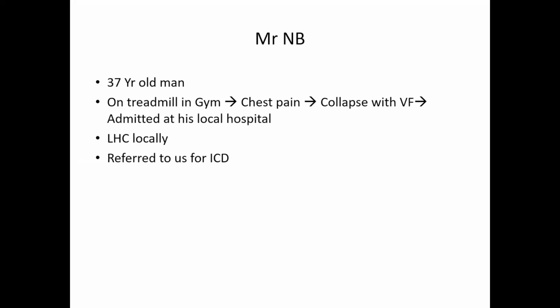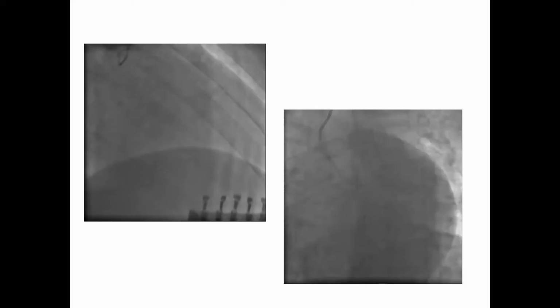Okay, so a 37-year-old man, he was on a treadmill, gets chest pain, he collapses with VF, admitted at his local hospital, who did the angiogram and referred him for ICD. I think we have got the angiogram pictures.